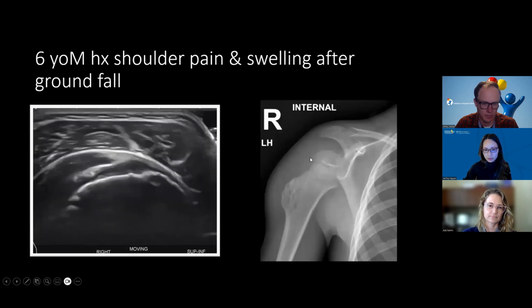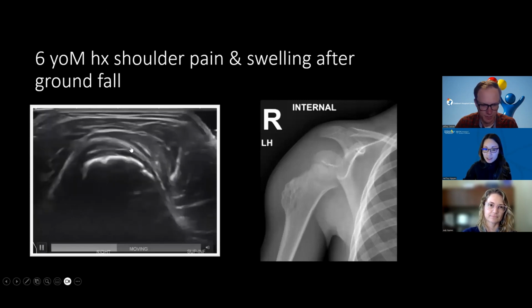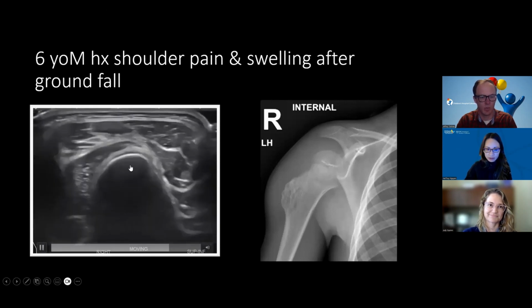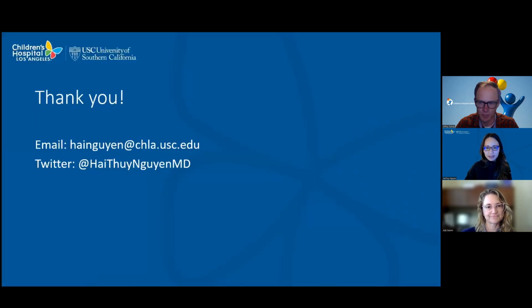And then, of course, you can always confirm it with a radiograph, and these can be easily followed. So sometimes you start off with ultrasound first, and that's all you have. So you should be familiar with what osteochondromas look like. I've seen these in ribs and different places where you tend to start with ultrasound just because there's a palpable abnormality, and that's what gets ordered first. So just be wary that that's what these osteochondromas can look like. And then that's it.